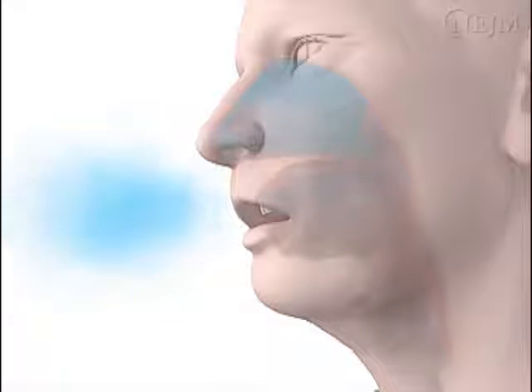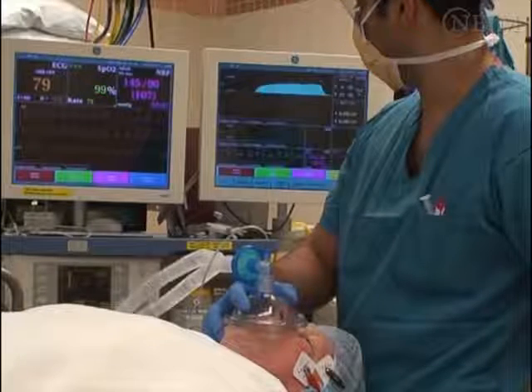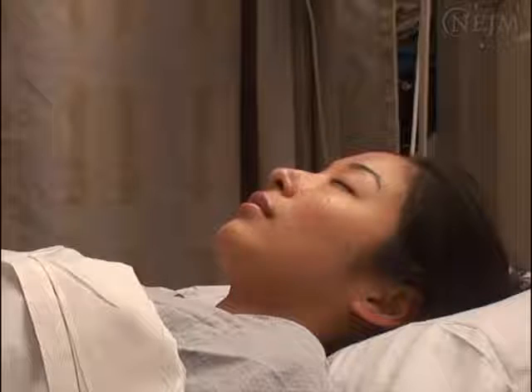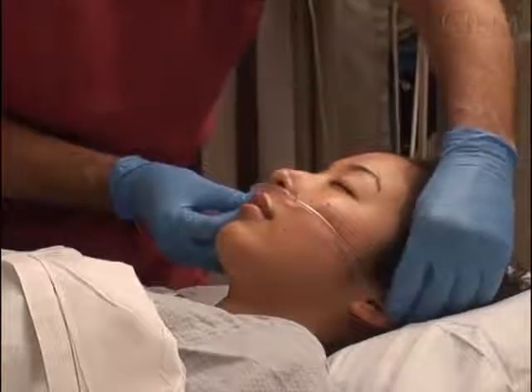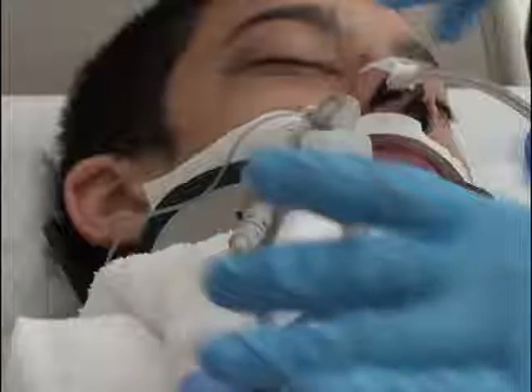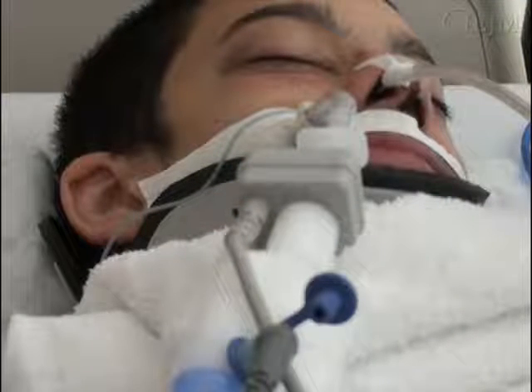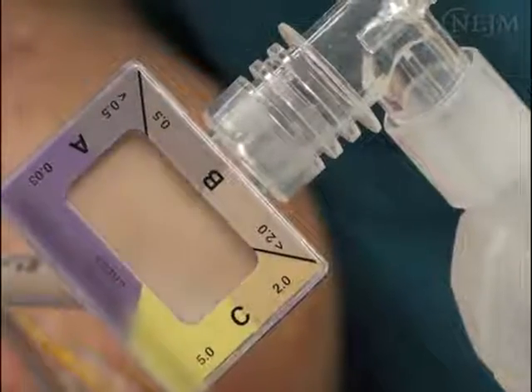The measurement of expired carbon dioxide provides insight into important life-sustaining processes that include metabolic, circulatory, and respiratory activity. Capnography is the standard of care for monitoring the adequacy of ventilation in patients receiving general anesthesia. It is also used to monitor ventilation during procedures performed while the patient is under moderate or deep sedation. Capnography is increasingly being used to monitor patients who are receiving mechanical ventilation in intensive care units and to aid in the assessment and treatment of cardiac arrests.